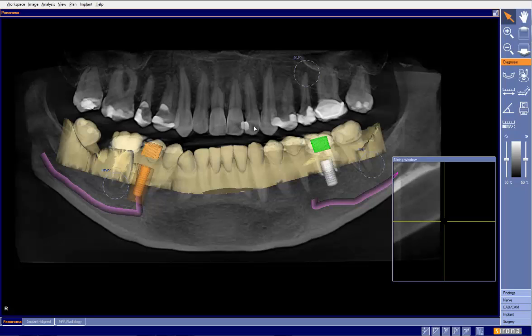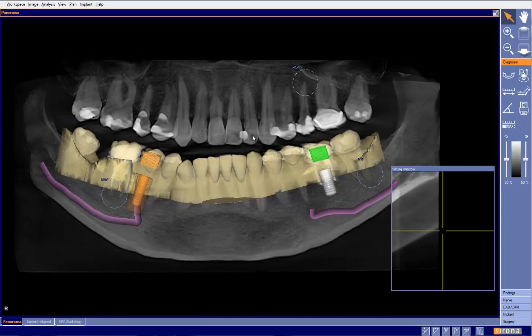Okay, today we've been sent a case to evaluate for a 3D scan, and I wanted to evaluate immediate placement in site number 19 and immediate placement in site number 29. There are a few things specifically I want to look at in this particular case.